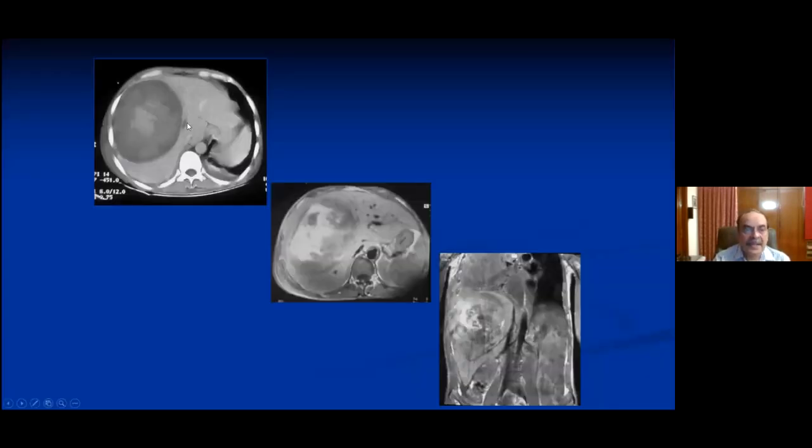So this is a non-contrast CT, where you have this hyperdensity within the center of this very large lesion. T1 weighted MR shows you bright signal on T1. There are very few things which are bright on T1. Hemorrhage and fat are amongst them.